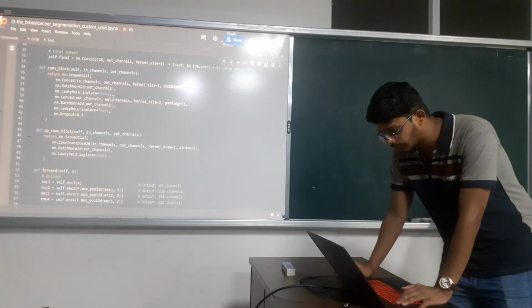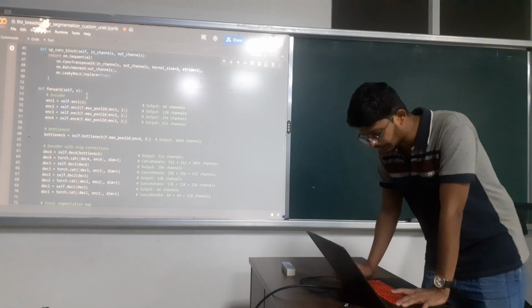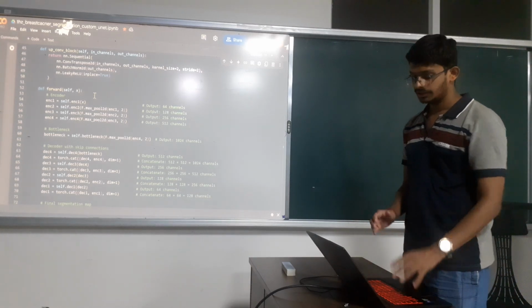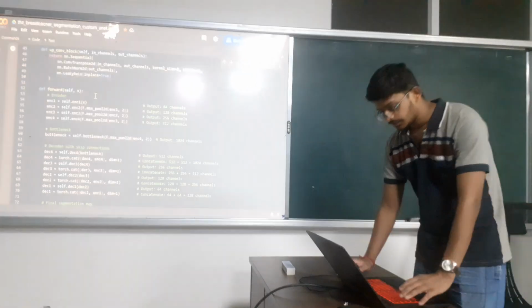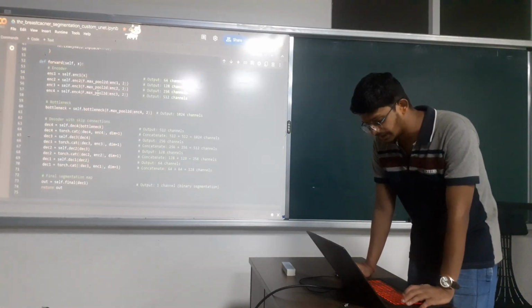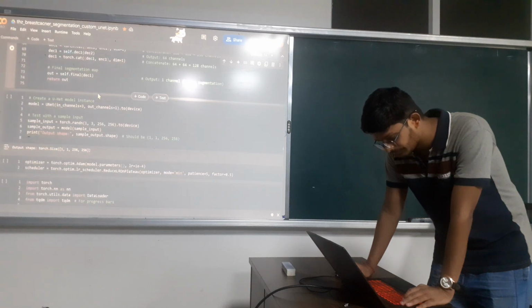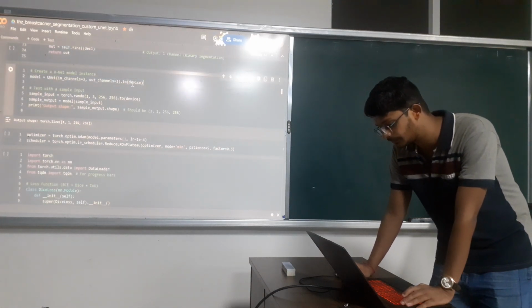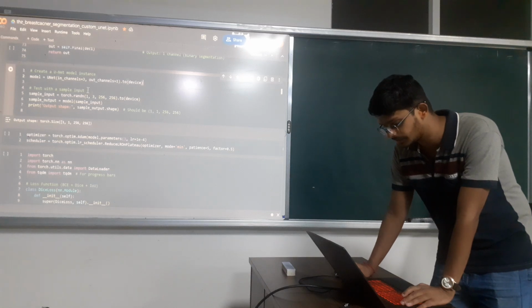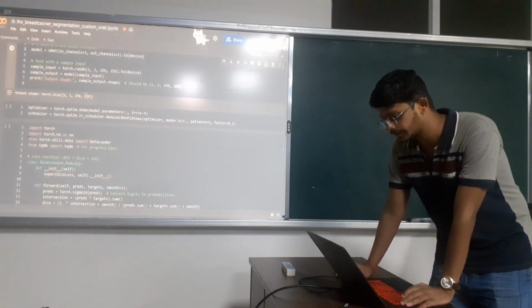This is the convolution block, this is the convolution block, this is the forward. Forward functions are used for defining the neural networks for the feed forward propagation and back propagation, so that all the max pooling, stacking, padding takes place very efficiently. So this is the class instance that I have saved to the GPU device. Device here is GPU CUDA, and the size here is 256.